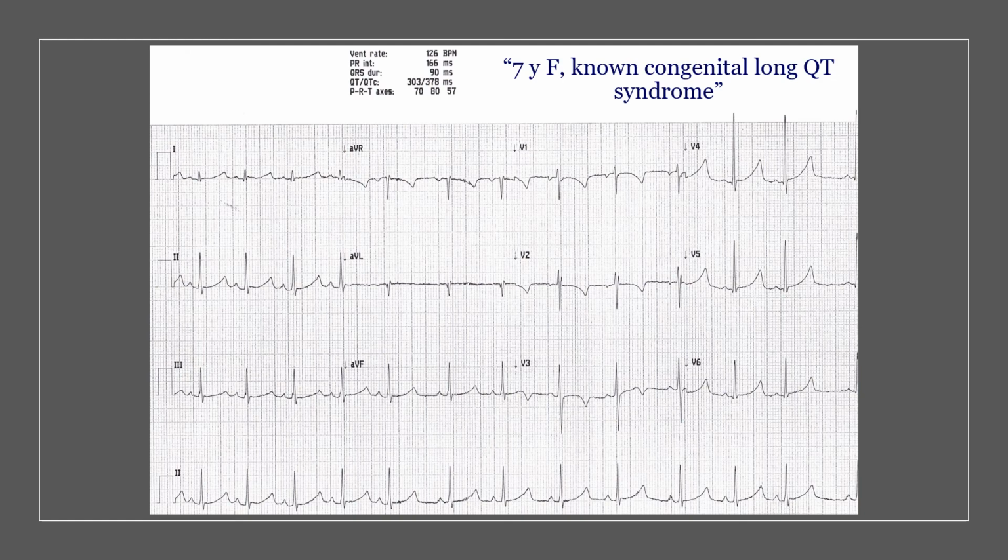But if you look carefully in this ECG, there is another thing that should catch your eye. It is this part here. So the machine thinks that the QTc is 378. And this is really bizarre, because looking at the ECG, the QT looks really prolonged. So 378, I would say this is within normal, if not heading towards the short side. So how come our eyes are saying something and the machine is saying the exact opposite?